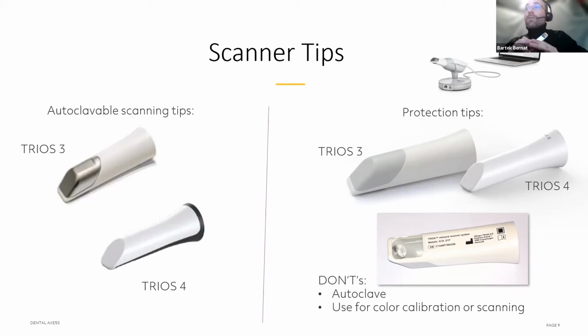So and also if you decide to cold sterilize your tips, it may last even longer, because then the tip is not subjected to the temperature changes, and then that's for sure gonna last more. So it's up to you how long your tip is gonna last. The other type of the tip is the protection tip that you can see on the right.